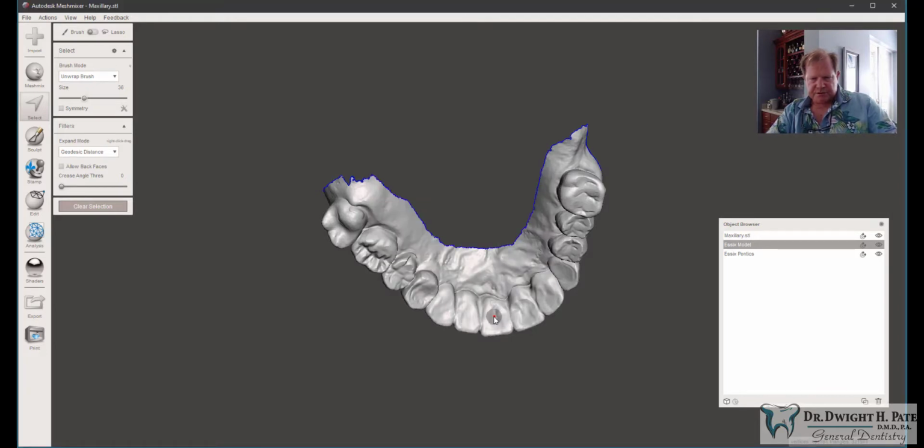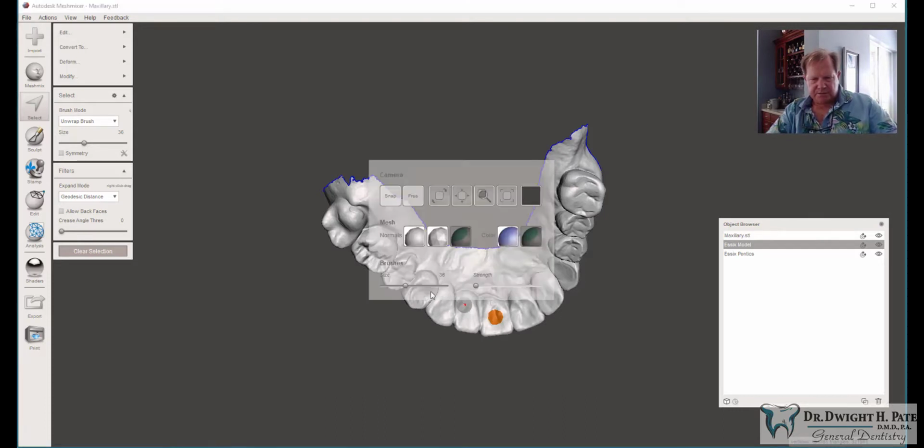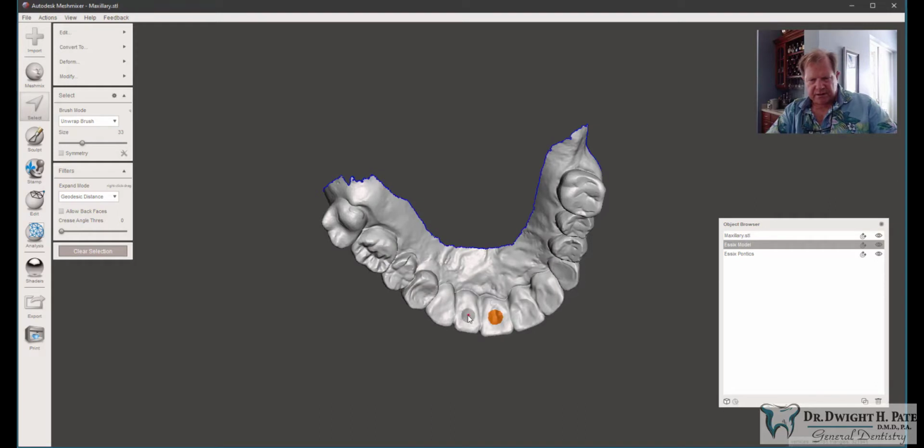I'm just going to click one time in the middle of that tooth to create a circular selection. Then I'll go over here, maybe slightly smaller for the lateral. The size is not critically important. You just want something that's going to create a nice little retention divot. Okay, so we're now going to intrude these 2 sections in order to give us the retention lock for our 2 pontics.